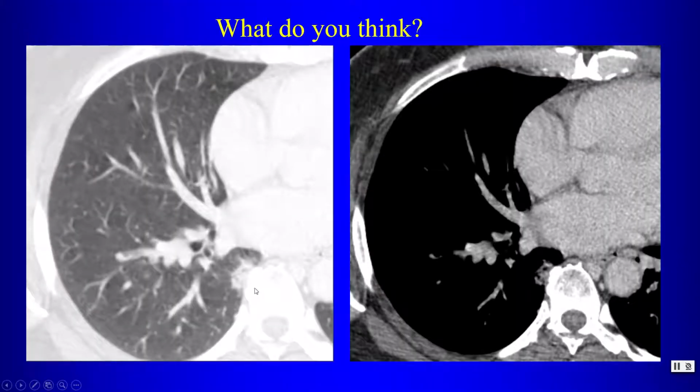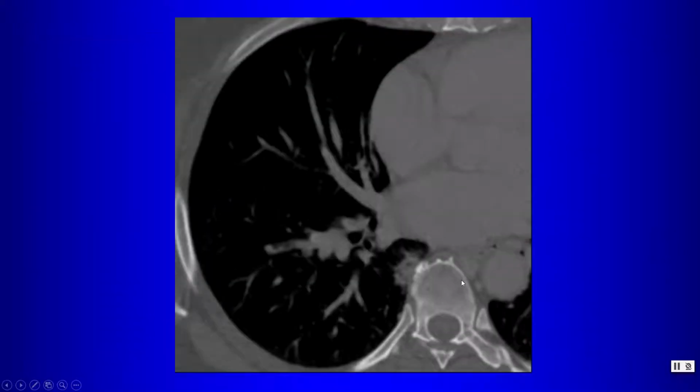This we can also see here where we have an osteophyte adjacent to the lung. We can see this area of ground glass attenuation with somewhat irregular margins. So this represents some scarring that can occur within the lung parenchyma, right where an osteophyte is poking into the lung parenchyma. That can result in a fibrous reaction and some scarring in the lung. And we don't want to mistake that for any type of malignant lung lesion.